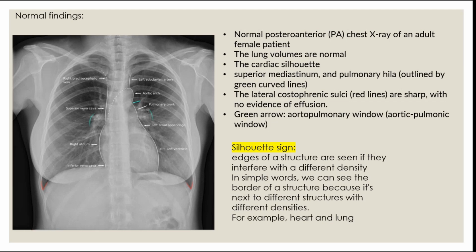We can see the costophrenic sulci, and these will be a parameter for us in case there's a change in the heart size, or we can see effusion. We can skip to the next one.